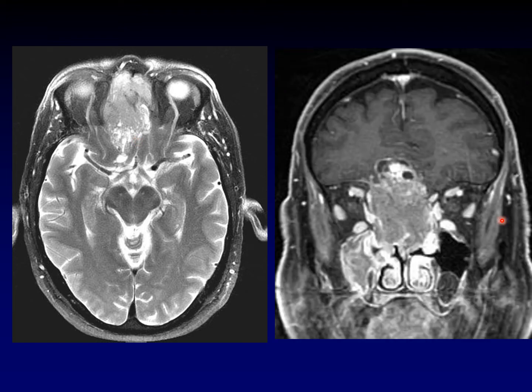When we switch over into the coronal plane, very similar to the last case, but instead of preserving the skull base and showing us exactly where that olfactory groove is, this mass completely destroys the anterior skull base. It erodes through that olfactory groove. None of that anatomy is present. This is a transcranial mass, and once again you can see these small cysts along the superior surface, along the cranial surface of the mass.